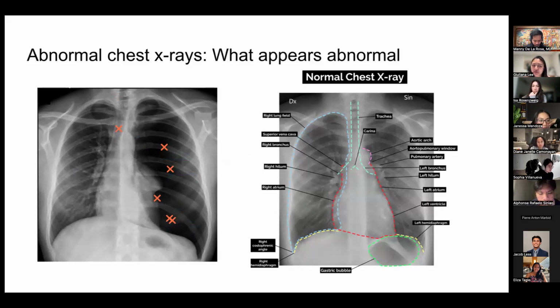Okay, we had a quick response on this one, and I'm seeing a lot of interesting stamps in a particular area. Does anyone want to call out what they see? Not necessarily what they think is going on, but what do they see that's abnormal?